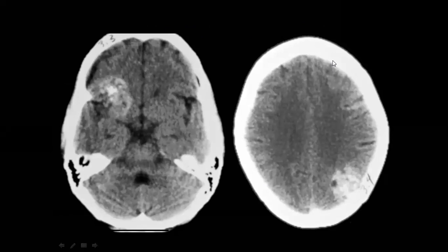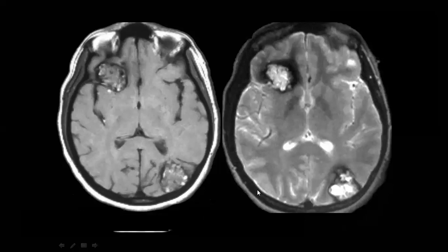The quality of the image is not very good, but let's check what it could be. Yeah, I agree. Secondary. Okay, so what could it be, this picture, CT brain with this lesion, and here there is another lesion, so we have at least two lesions. Multiple meningiomas, yes, could be. What could be the differential? I think you will change your mind now, right? Yeah, it can be cavernoma with this MRI.